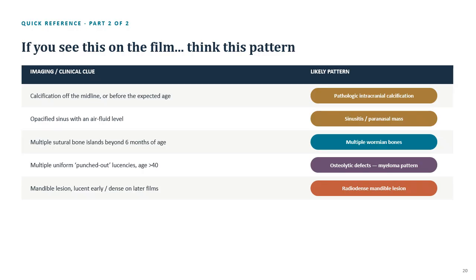So remember, calcifications can be normal, especially when we expect them based on the patient's age, and also when they appear in a location that we typically expect them to be in. But when they're unusual in terms of the patient's age, unusual in terms of the location, or even the appearance, that can be a warning sign for us or for the radiologist and the doctor as well.